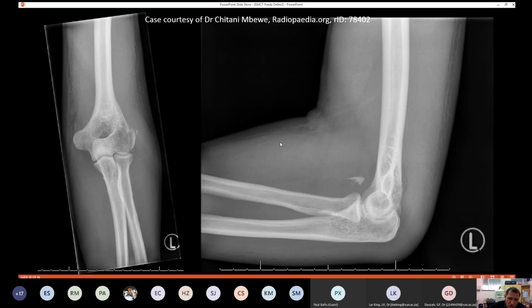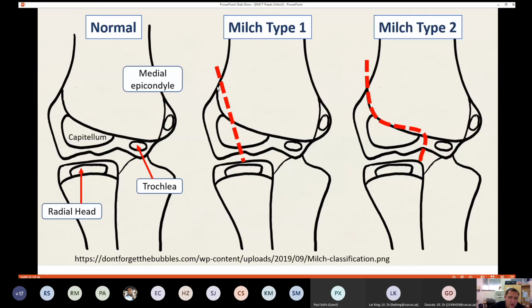And if you look at the lateral, obviously the soft tissue swelling is quite significant, and you have a loose bone fragment that's sitting superior to the joint that might need to be removed so as not to impair the function of the joint in these injuries.